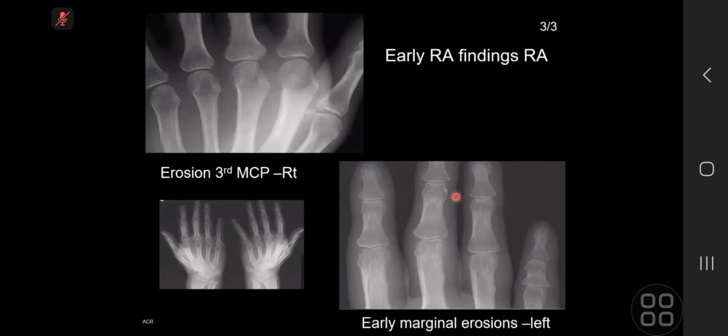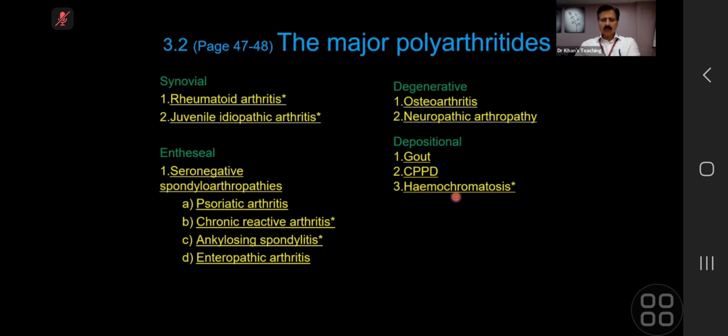So I'd consider, I may put chronic reactive arthritis in the differentials, because in the early phases you can get osteopenia, and possibly SLE, although it's not very specific. I wouldn't really have any other differentials. Okay, excellent.